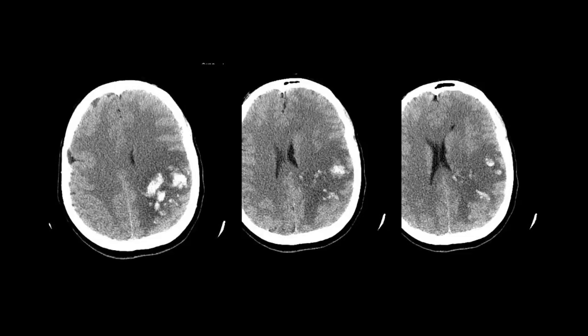So let's come back to our intracranial hemorrhages. So we discussed again head trauma, we saw arterial hypertension, amyloid angiopathy. We discussed in depth all those vascular malformations. Now we're getting into the patterns that are a little less frequent. And here you can see in this patient, basically you can see that there are those patchy hemorrhages. So we don't have a big blob of intracranial hemorrhage like we have seen in our previous patients, for instance, with the arterial hypertension or the amyloid angiopathy.